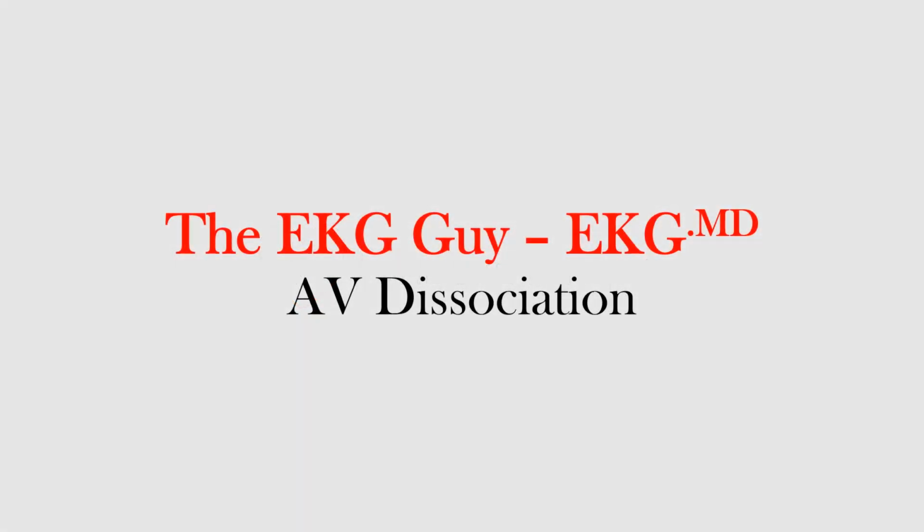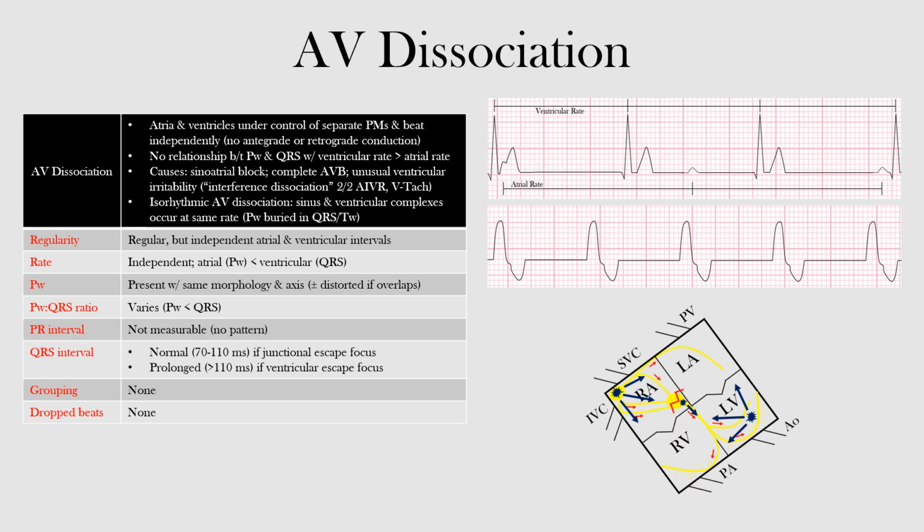In this lecture, we will discuss AV dissociation, including its mechanism, EKG features, and potential causes. Atrioventricular or AV dissociation occurs when the atria and ventricles are under the control of separate pacemakers and beat independently. This results in no relationship between the P waves and the QRS complexes. In other words, they occur independent of each other, with the QRS complexes or ventricular rate being greater than the atrial rate or the P wave rate.